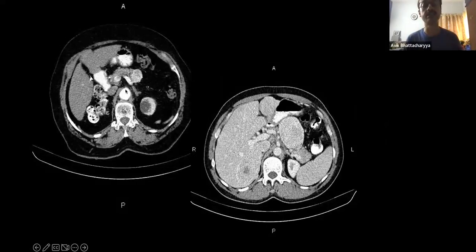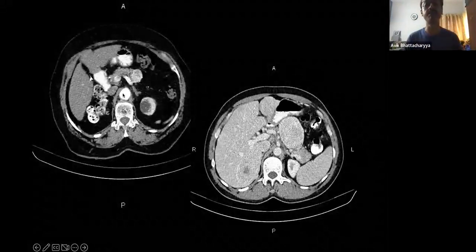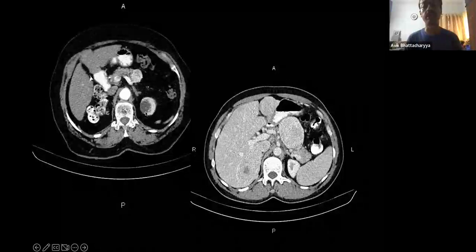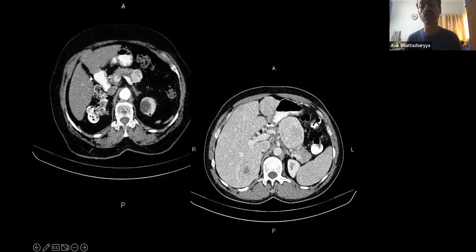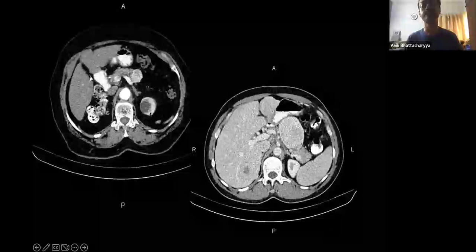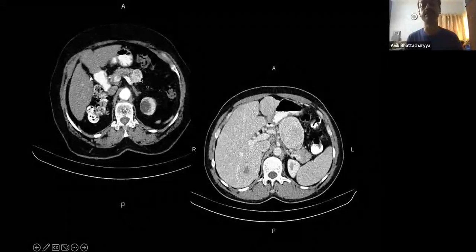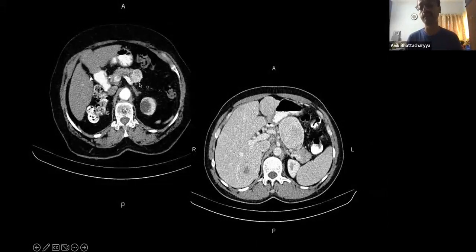Here it is, see the aorta is bright. There is no contrast inside the inferior vena cava. That means it is an arterial phase. You can appreciate that the cortex of renal tissue already has contrast inside. That means this is not the early arterial phase. This is the late arterial phase study, where you can see a hyper-enhancing tumor at the region of the pancreatic tail.